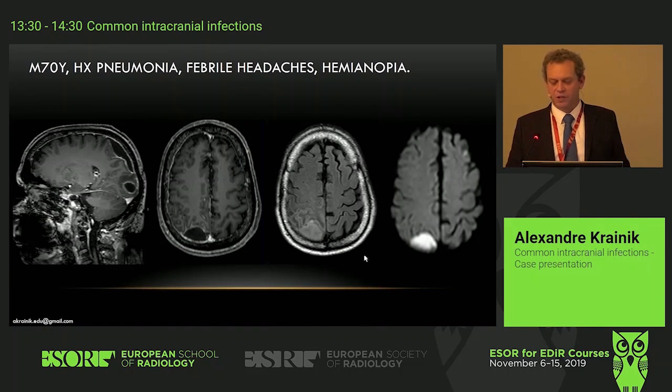Another example, okay, then we will skip that one. Again, different context, but you see that the water suppression doesn't work, and even on the empyema, you have an increased signal on diffusion.